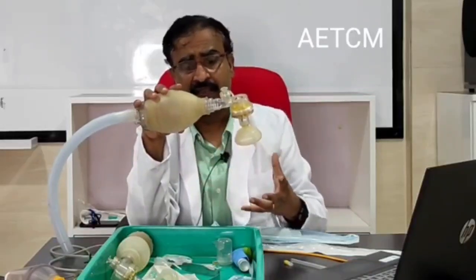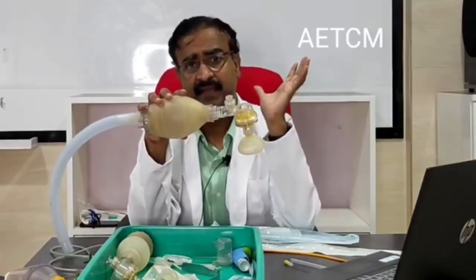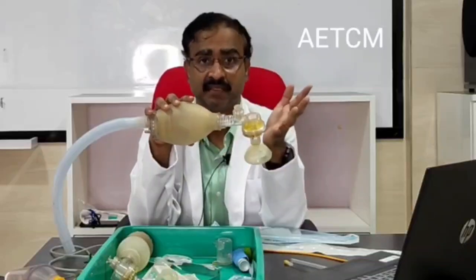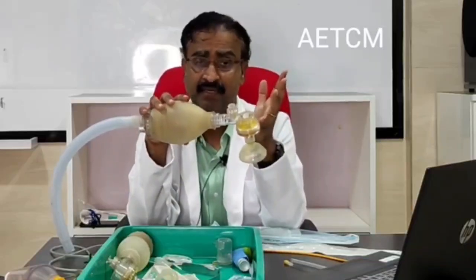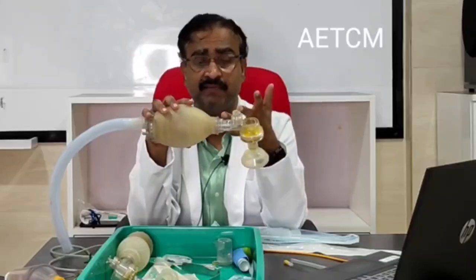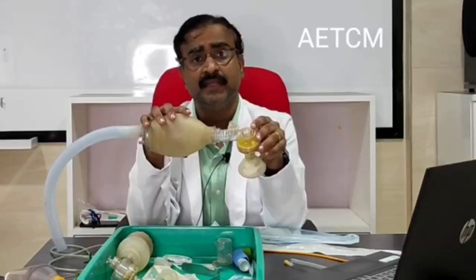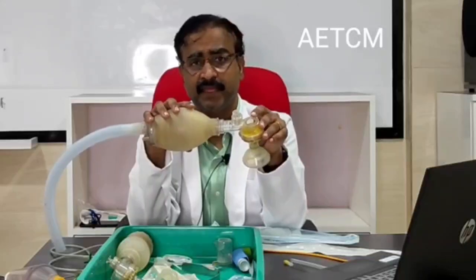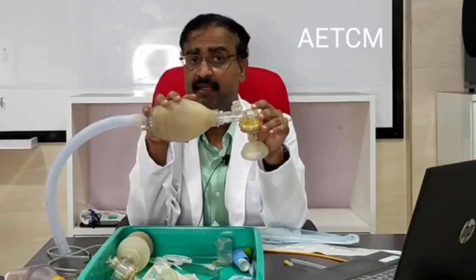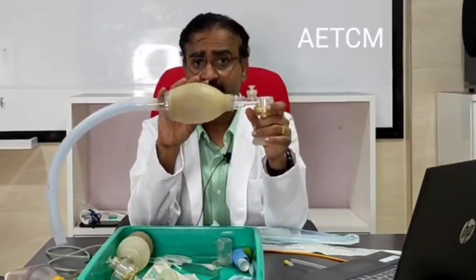This air would enter the gastrointestinal tract, would fill this intestine, and this would begin to push the lungs to the opposite side, making it hypoplastic, and that is dangerous. Already one hemithorax is filled with intestines. We don't want the other functional lung also to get damaged and compromised, and that is why congenital diaphragmatic hernia is the absolute contraindication for using an ambu bag device. So that is about the ambu bag.